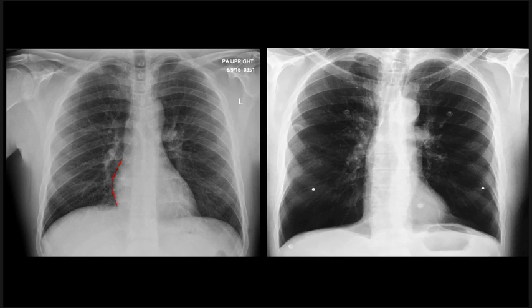What if it doesn't project beyond the thoracic vertebral body, or barely projects beyond it? This actually happens in a small percentage of patients, and when it does happen, the heart border often has a blurry appearance. So if the heart isn't projecting past the thoracic spine, you often don't get that sharp border. It doesn't mean that there's an airspace process there, it's just the way it will look.